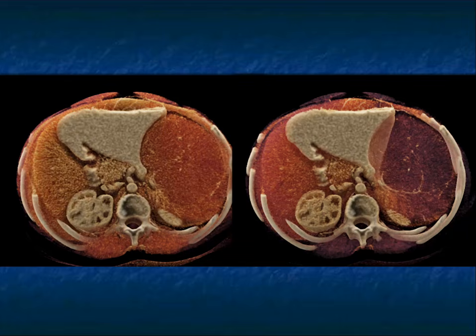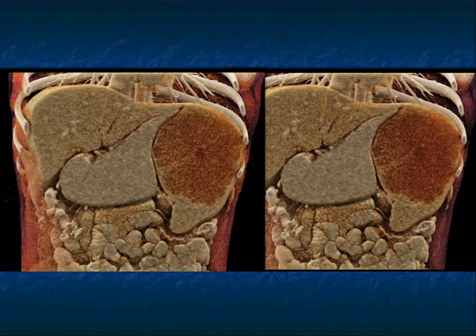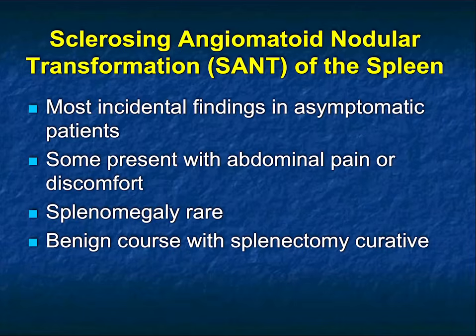That's the diagnosis. But the way you know the diagnosis is because the patient had a splenectomy. We described it as a mass, and this mass was solid, so we were concerned it could be a malignancy. Could it be an atypical hamartoma, a really strange hemangioma, littoral cell tumor? It's a mass, it's obvious, but it's really large, and it is concerning to all of us. And so we were able to make the right diagnosis in this case. Really nice example. And the right diagnosis is do a splenectomy, and then you had the answer.